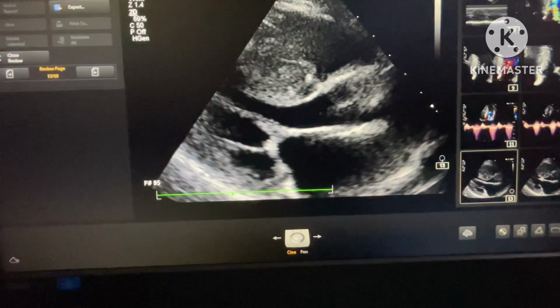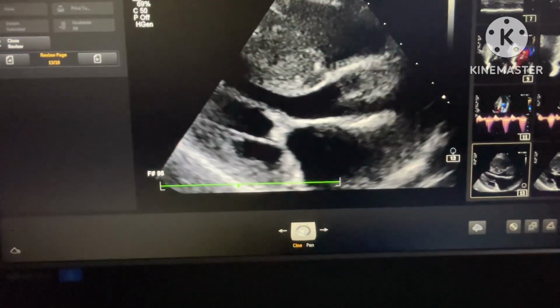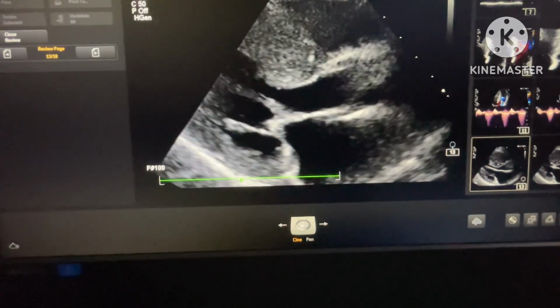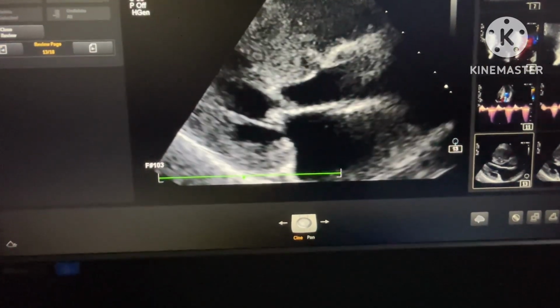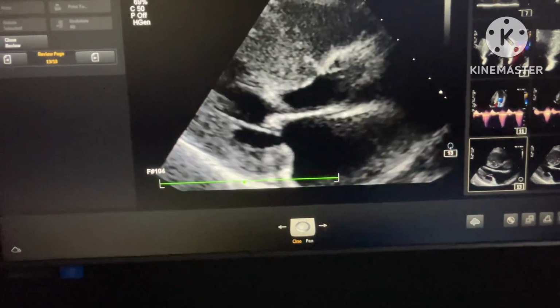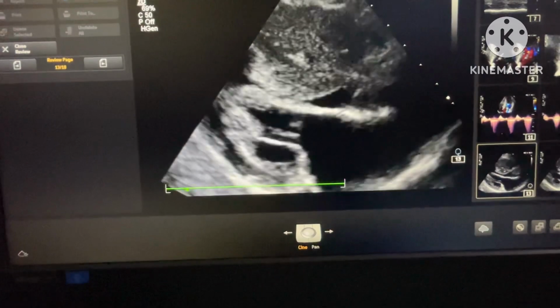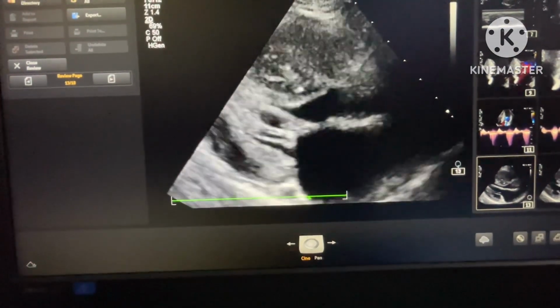But it should touch in the closed position of the mitral valve. In the open position, the valve is touching the septum anyway because it is open. But even after closing it touches. The valve closes and touches, closes and touches, closes and touches. That is SAM. Thank you.